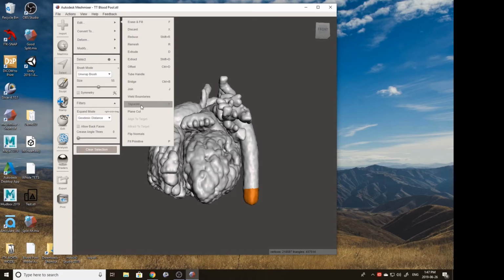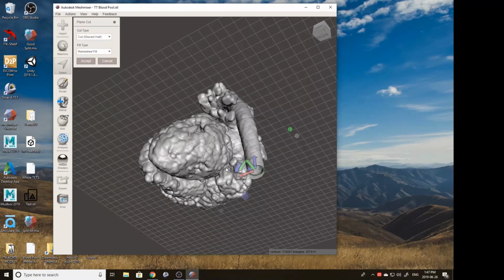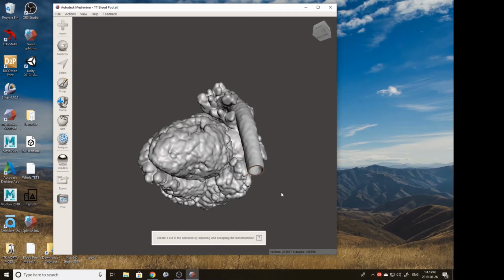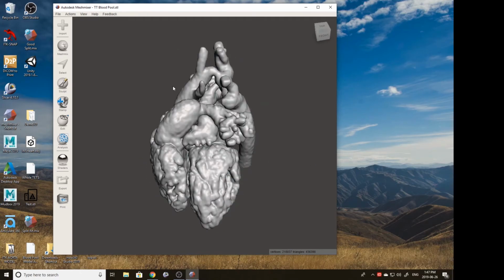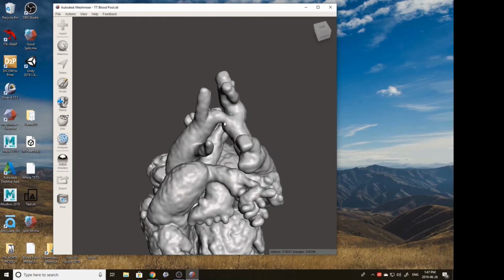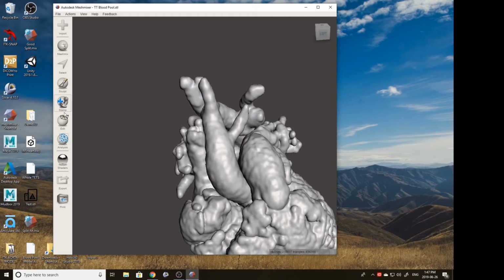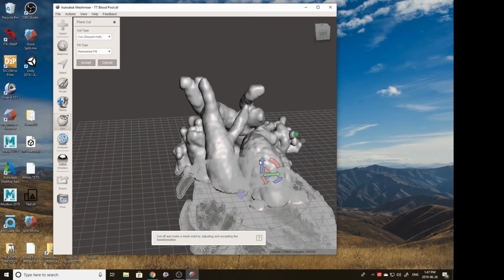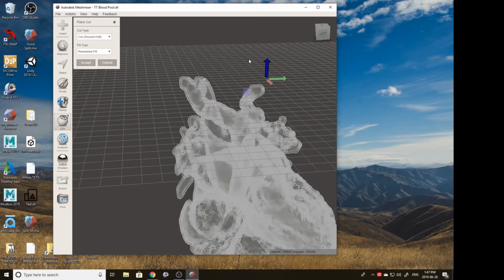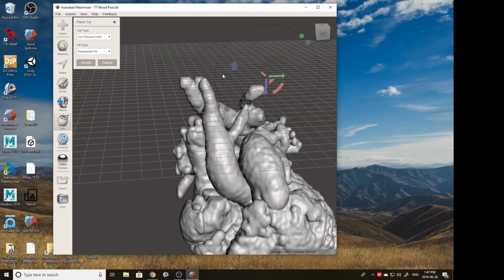And we can see then it'll only affect that area that's selected. Perfect. Now there is that coarctation of the aorta, and I want to open up some of the branches. I think that's what we're doing next. Yep. So here you can see that big blue arrow, once you click it, it decides what side of the model you are cutting.